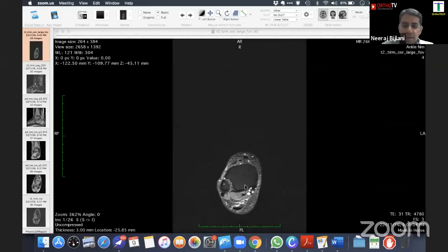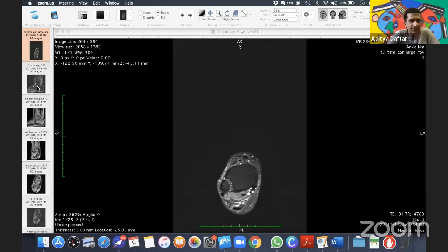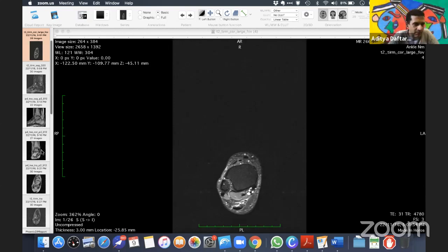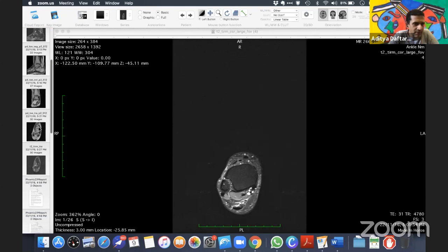Let's see. No, not this. Let me share my full screen. Then that'll be better, I think. Yeah. So can you see this? Yeah. Which image do you want me to show, T2? Come down to the PD image, come down one more. No, yeah, that one.